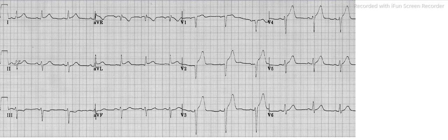So it seems to have sinus rhythm to some extent, and there is no AV conduction delay. That you can rule out from here only. And the P wave morphology in lead 2 you can see is normal. In lead V1 also it is normal. So the P wave is normal.